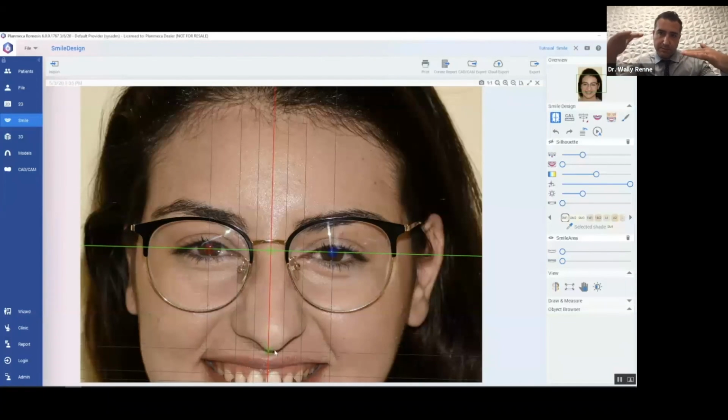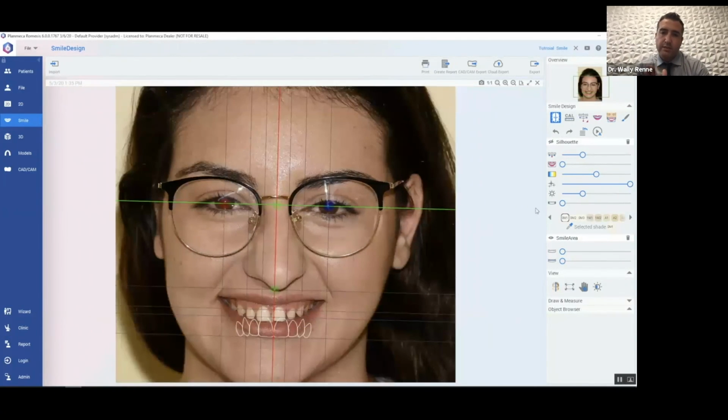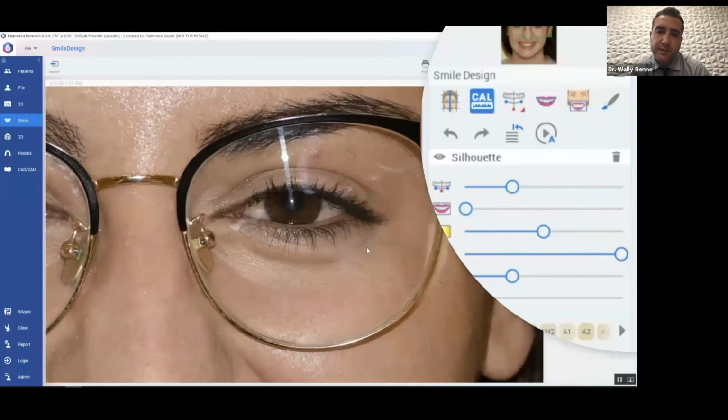And so we're just going to make the interpupillary line parallel to the horizon, with nasion and subnasale marked to get the midline and interpupillary line and everything like that. You'll see once you hit okay, the photograph is going to upright a little bit. So now it's perfectly parallel to the horizon, based off of this patient's face.